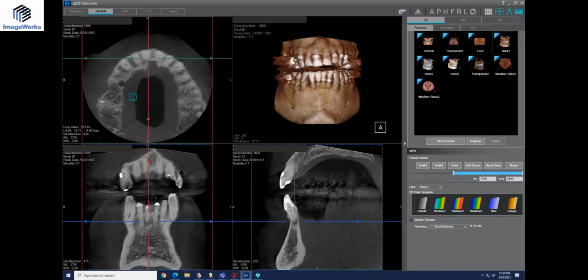Even if you were aware there was a problem as the dental professional, it's hard to convince the patient, no, you should really take care of this because this is bad. Looking at the 2D picture, especially for a layman, he would say, I don't see anything wrong with that. It looks fine to me. And it does not look that bad on a 2D picture.